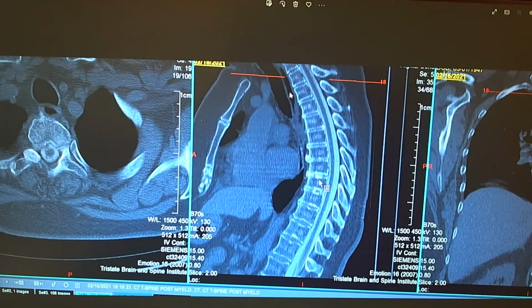It might be the esophagus because I see that structure is behind the trachea, going up and down. No, it's not a vein because the content of it is black. I think you might be right. In this case, it is probably the esophagus, but this is unusual. It is very unusual to see the esophagus, but with a big trachea and something behind it, you might be right here. Okay?